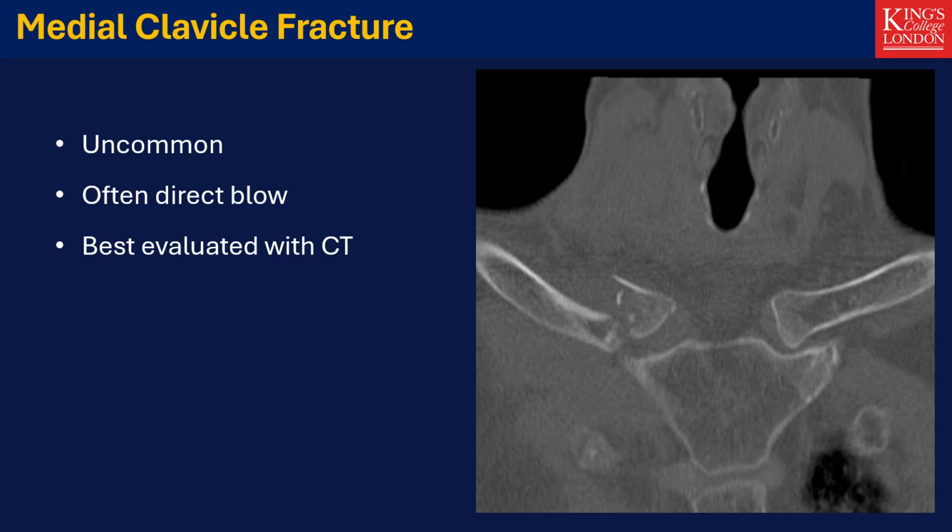Medial clavicle fractures are uncommon, accounting for only a small percentage of clavicular injuries. They may be extra-articular or extend into the sternoclavicular joint. The critical issue is displacement. Posterior displacement places the subclavian vessels, brachiocephalic vein, trachea, esophagus, and brachial plexus at risk.